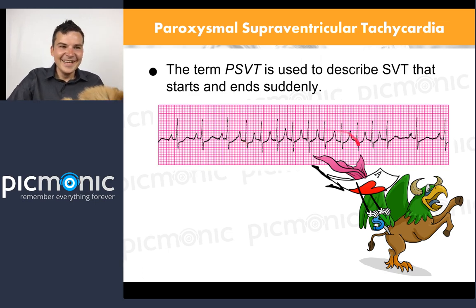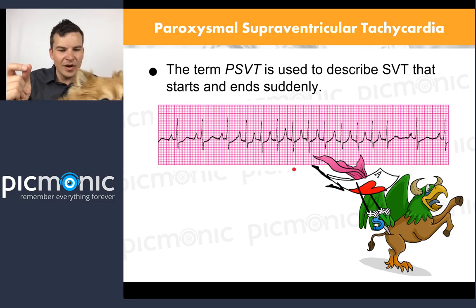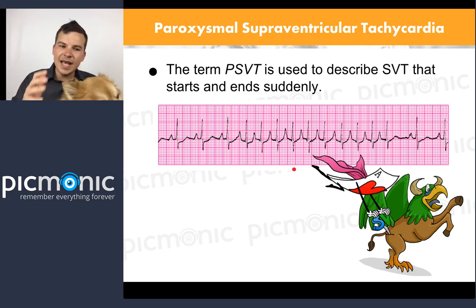Sorry. As we look here, this is why we call it paroxysmal. It's normal, it comes and then it goes away. Before I talk about that, when we talk about SVT, it's really important to know that SVT, paroxysmal SVT, anything that's randomly coming and going, is usually a sign of something that's going to come and stay and be very problematic. This is the same when you think about TIAs, transient ischemic attacks. They come and go, and you're all fine until you get the big one, and then it doesn't go away. It's the same with PSVT.